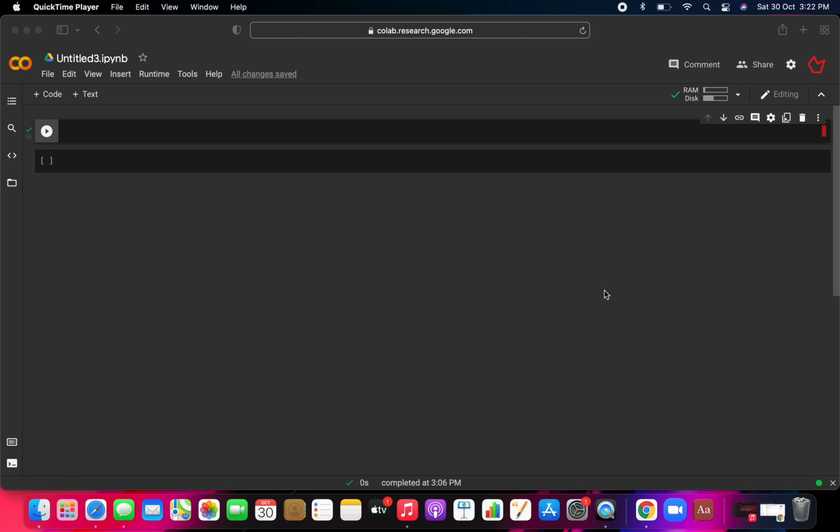In this particular video, we will implement one of the famous datasets, that is brain tumor. With the brain tumor dataset, you will have the images. On the basis of those images, you will build a model, and that model will be able to classify whether the person has a brain tumor or not.